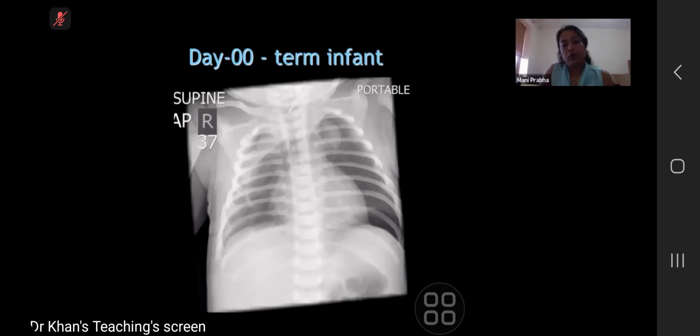Okay, let me take over. And see, there is more lucency on the right side, which is projecting up to here, isn't it? And there is an opacity here, which is the left lobe of thymus. This is the right lobe of thymus. And why is the mediastinum not shifted in this one? Because the pleura actually goes on to the other side and the air is only in the pleura. So this is a case of pneumothorax.